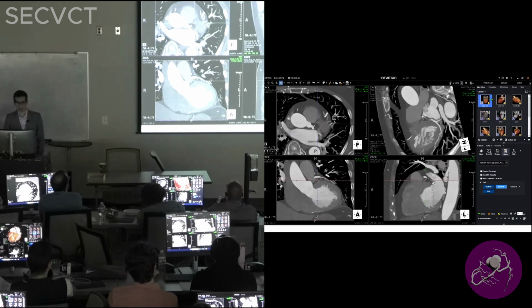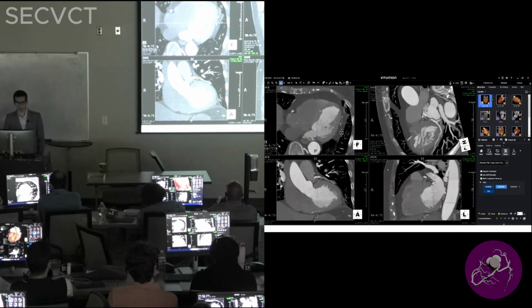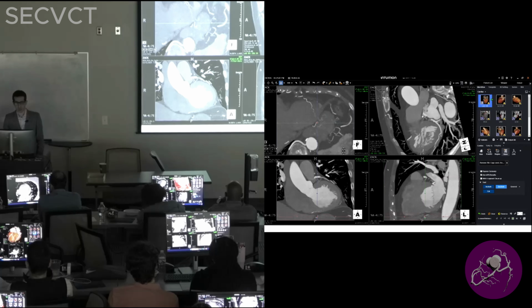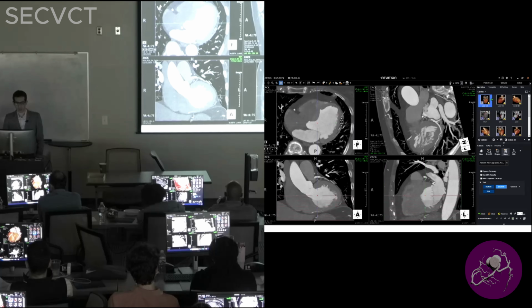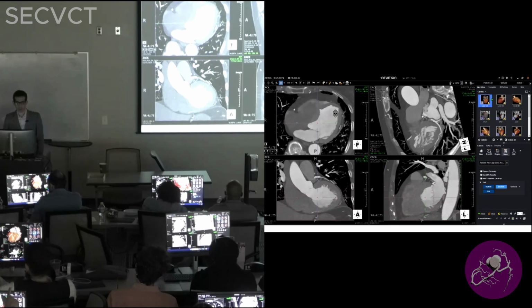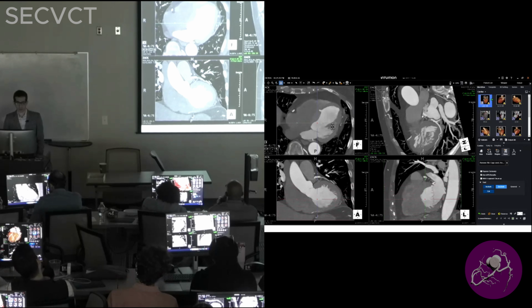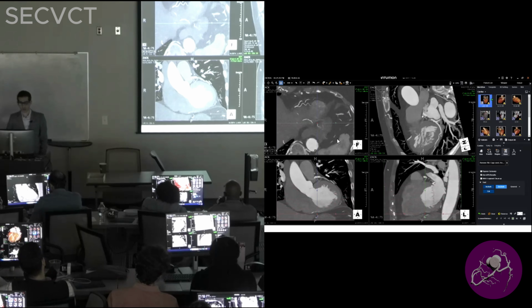We come down, there's a focal lesion in the mid LAD, which gives a good size diagonal branch, comes down, then the LAD tapers down. So it's not the largest LAD, so you expect to have a large PDA, and then the PDA, and then there's actually some incidental finding. I might ask you later on to look at it. But then let's look at the circ. Circ gives a large size OM, another OM, and then dies off. RCA so far, nothing really impressive. We come down to the mid segment and down, down, down. So there's a questionable lesion in the LAD.